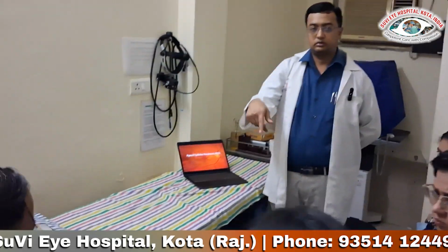Multilobular PED, notched PED, and thumb-shaped PED, complex and multilobular PED. There will be a big PED with a notch, like an M-shaped PED. And one very important sign is described as SIRE, shallow irregular RPE elevation. Also the presence of the double-layer sign.